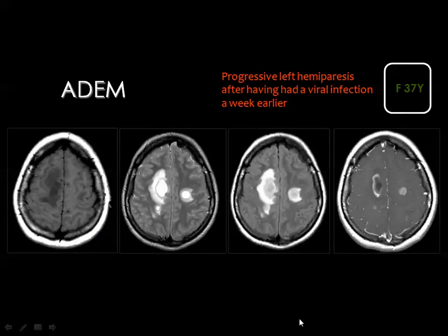And this is also a case of acute demyelinating encephalomyelitis, which cannot be discriminated from MS on the basis of imaging, since you see low signal in the T1, high signal in the T2 surrounded by edema, high signal in the FLAIR, and after injection of contrast you can see this typical pattern of enhancing MS plaques, which is an incomplete ring or incomplete marginal enhancement.